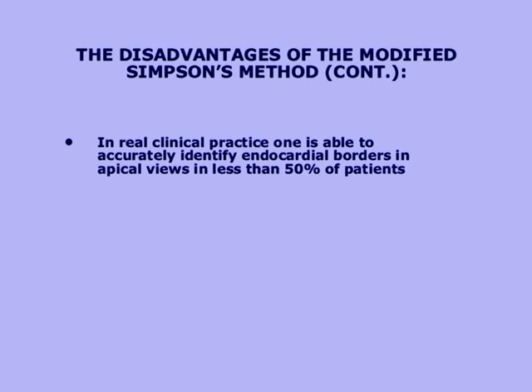It should be noted that in real clinical practice, one is able to accurately identify endocardial borders in apical views in less than 50% of patients. Thus, it is absolutely necessary to use additional techniques such as harmonic imaging and contrast agents.